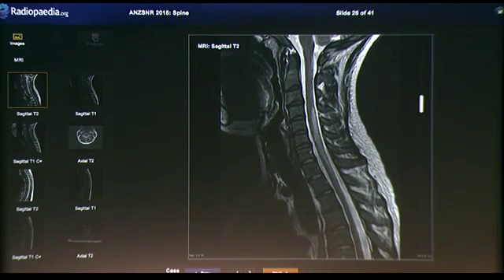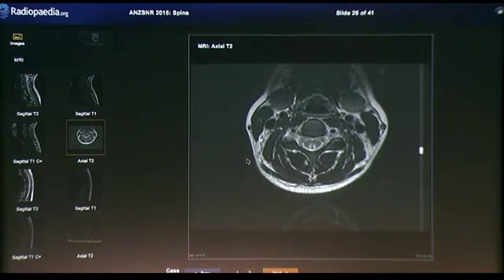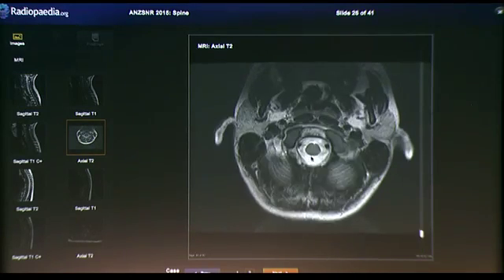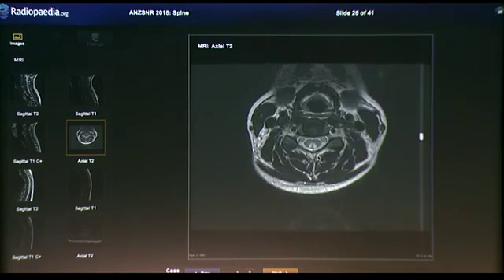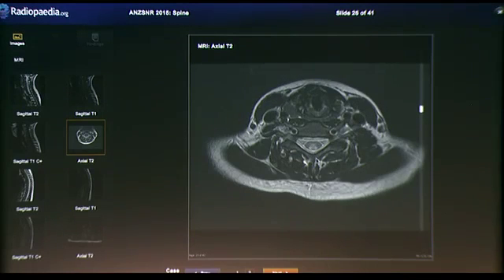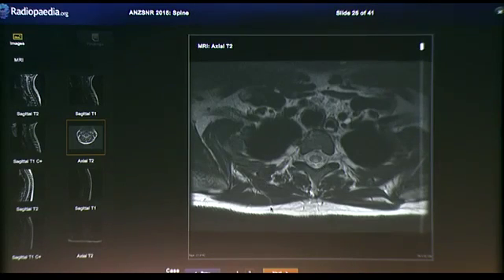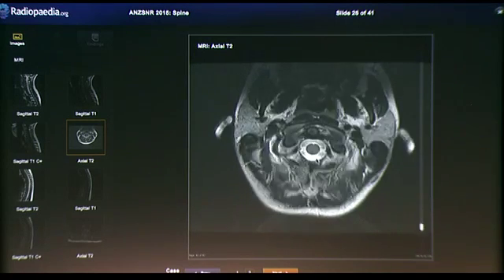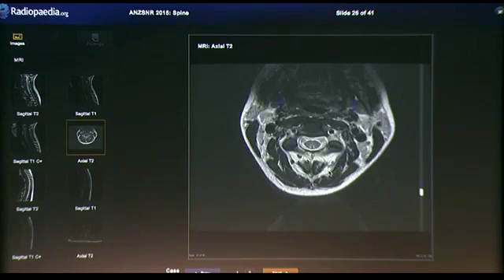And what we have here is a fairly longitudinal extensive T2 hyperintensity, cervical down into the thoracic region, and on axial sequences demonstrates quite nicely that kind of V-shaped involvement of the dorsal columns. So that distribution is pretty suspicious for a B12 deficiency or subacute combined degeneration of the cord. There is a differential, so subacute combined degeneration of the cord can be from B12 deficiency but also copper deficiency.